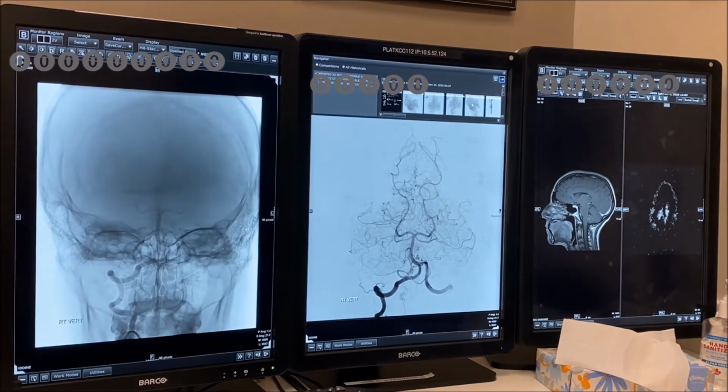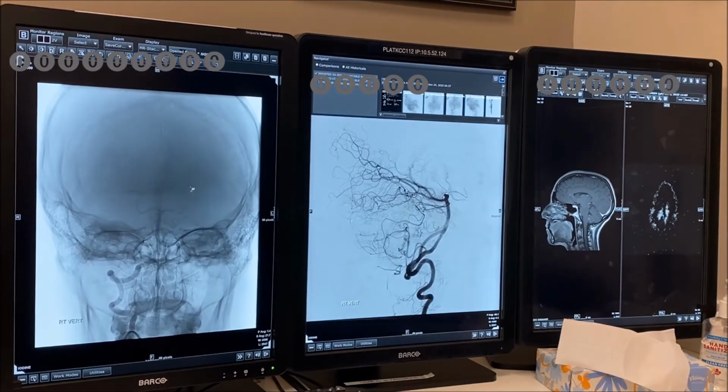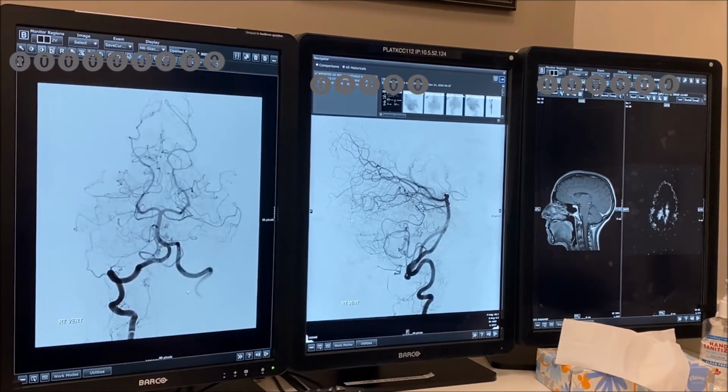They obviously did the first AP and lateral, and then they did the opposite vert, right? So here, the lesion is coming off the left PICA. By the way, do you know who this is? It's the branch to the dens arcade. We have to decide what this artery is. Do you know what this artery is? Anterior spinal. A good way is to look at the lateral. Anything that projects anterior to the vertebral is going to be part of the ascending system.